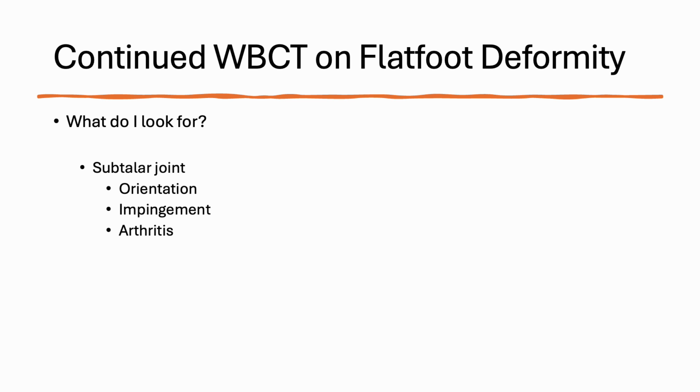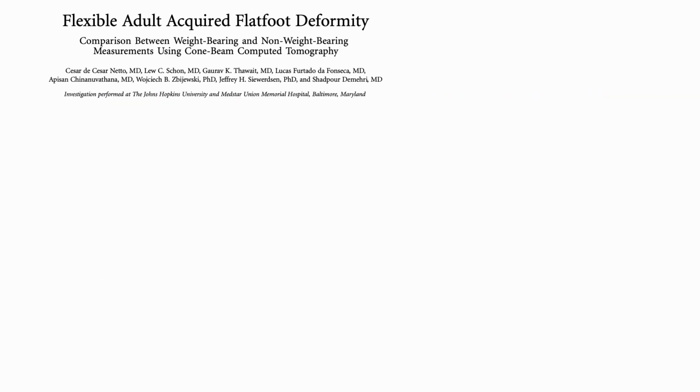And then there is arthritis evaluation. There is some facet evaluation that you can look at, but I'm not super tied into that. In the midfoot, I'm looking at the collapse and abduction. So I'm looking at how much the talonavicular joint is collapsing and allowing rotation that allows the abduction of the foot and then the collapse of the medial column. Those are the things that I really dive into when I'm looking at it.